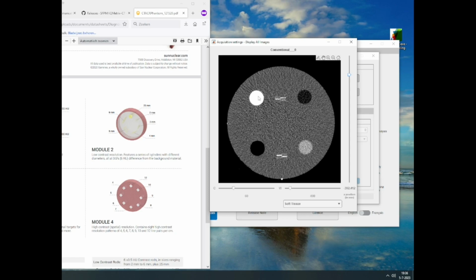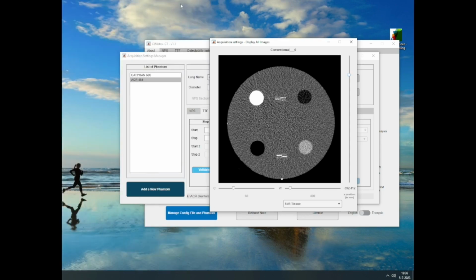So what you see with this scan is that the image has been flipped around the y-axis. That is something very important to note. This might also be happening with your analysis. Always check how is your phantom depicted when you open it up. Always check how is your image displayed. Always make sure to select the correct insert. So we're going to use module 1.